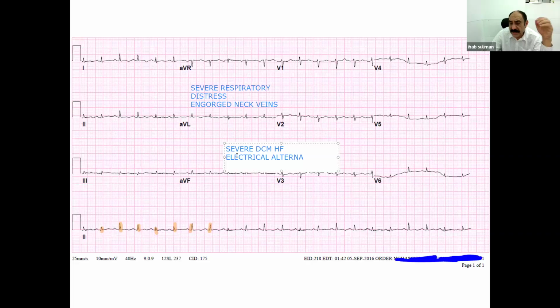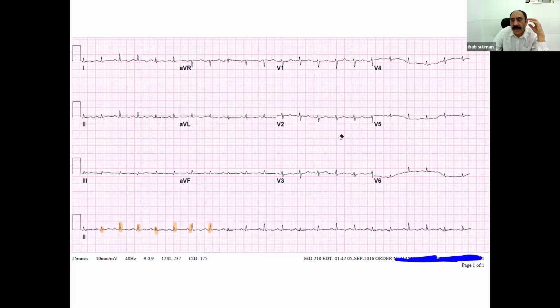So it is important to recognize such an ECG because it can give you a hint that this patient could be sitting on a pericardial tamponade, Beck triad. So you need to really treat him with pericardiocentesis under echo guidance, after you do your necessary workup. The X-ray will show what is called a water bottle chest X-ray appearance, and it is important to treat it. Thank you.